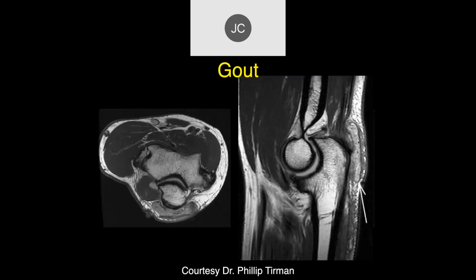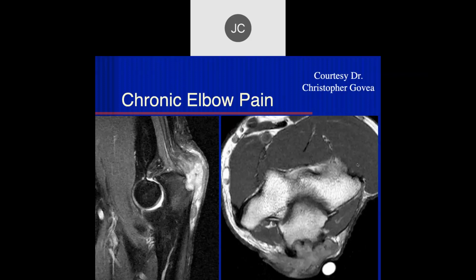This is pretty typical of gouty bursitis of the olecranon. I ended up not having gout. It was just from a pressure lesion, and I had a venous hemorrhage into the olecranon bursa, which caused pain in my situation. Hemorrhage and infection is far more common than gout.